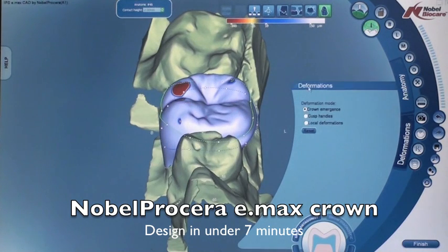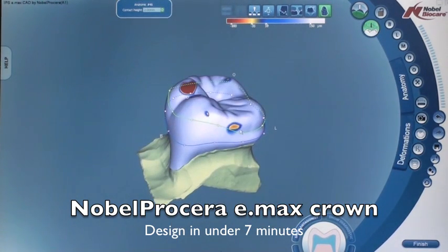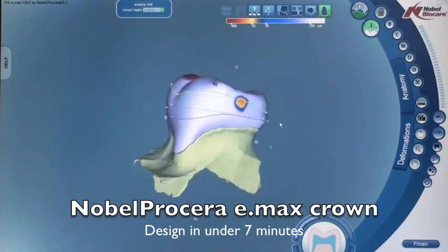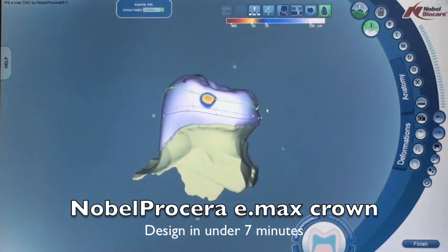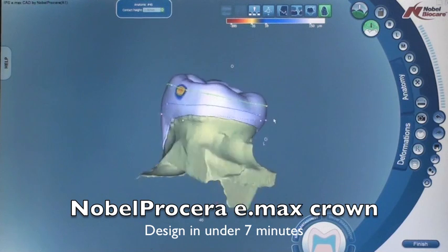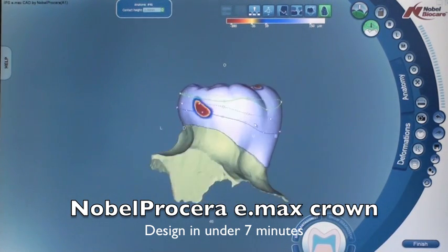So next step is crown emergence. Just get rid of everything. And what I usually do is I usually bring this line up. It tends to be a little bit low. Now again, I don't spend a ton of time on this particular feature, as I like to do a lot more with the drag surface instead. But what I usually do is I usually do flatten off my interproximal areas.